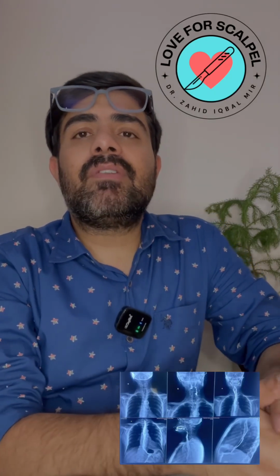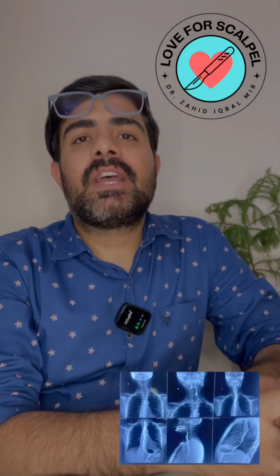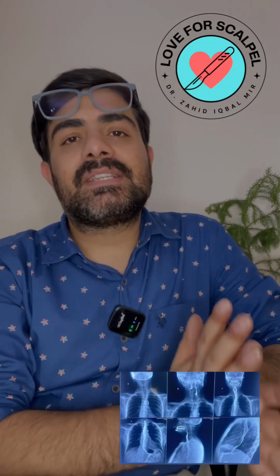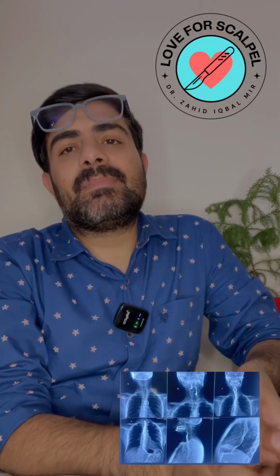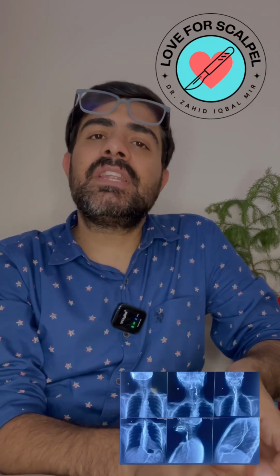Looking at the frontal view, the narrowing is at the level where the tracheal shadow and the main bronchus bifurcation, that is the carina, seem close. The lesion is just around or below that. In lateral views, the narrowing is well above the diaphragm and it is not at the cardioesophageal junction. The contrast column abruptly stops at a point higher than where the diaphragm contour appears, suggesting that this is not a distal esophagus lesion. The lower esophagus beyond the narrowing is partially visible and seems patent, indicating the lesion is in the proximal to lower third. The involvement corresponds roughly to the carinal level or just below it, which aligns with the mid esophagus.